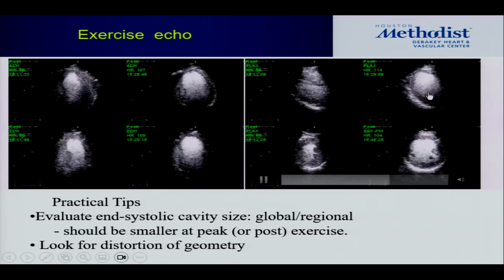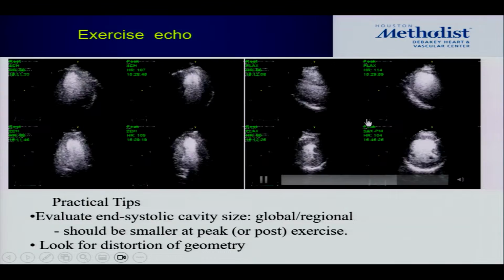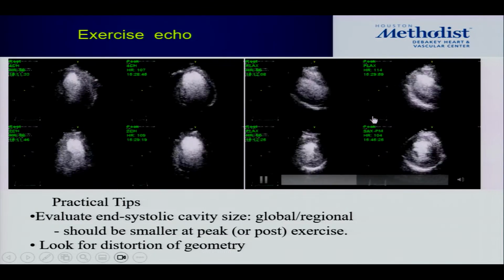However, look what's going on here. Can you all see this QRS? Can you all see it? I don't know if you can see it from the screen. But actually, right here, the system captured a PVC.